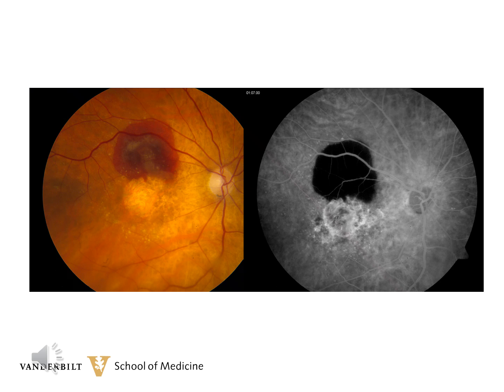This patient has bled under the retina from a choroidal neovascular membrane. The clinical photograph shows not only the hemorrhage, but the central macular atrophy that she has with her degeneration. Also, inferior to the atrophy, you can see some yellow drusen.